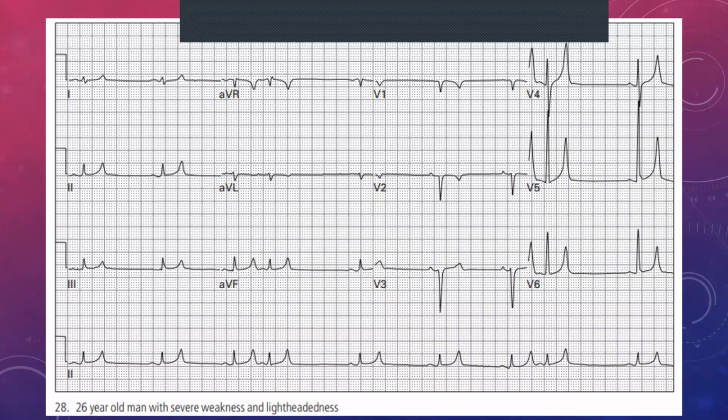When you see an ECG like this, it might be a bit overwhelming at first, because there seems to be quite a bit going on. The first thing always is, if you're unsure, break it down into little pieces. Once you've broken it down, ask for help if you can't get an answer. And if you can figure out the answer, then go ahead. But hopefully we'll try and figure it out.